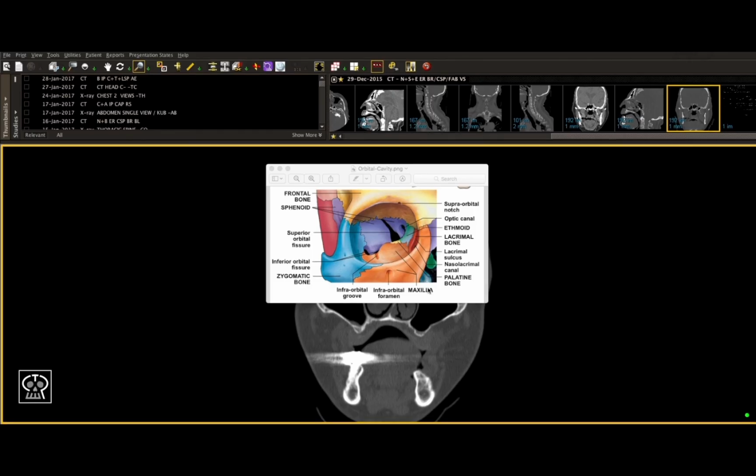This same principle applies to the rest of the orbit. As you head into your practice scans of the orbit, make sure you mention fractures of the orbit with their correct terminology. That is, the inferior orbital rim, the lateral orbital rim, superior orbital rim, the medial wall, the orbital floor, the lateral wall. Describing the area of the fracture is more useful than describing the actual bone itself. Also, don't forget to include an evaluation of all nasal bones when doing your practice scans, as you will be asked to comment on the presence or absence of nasal bone fractures going forward.